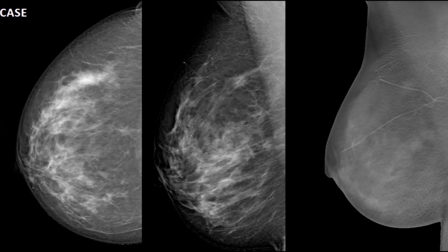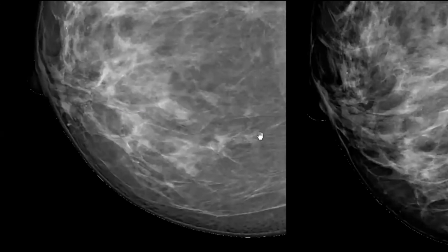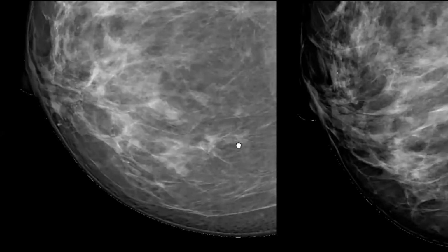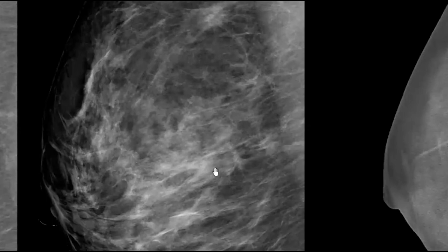If you are familiar with mammographic imaging, you may also notice in this resolution that there's something going on in this area of the breast. But you can't be too sure where it is. Maybe, to give you some help, it's in this location at 3 o'clock in the imaging.